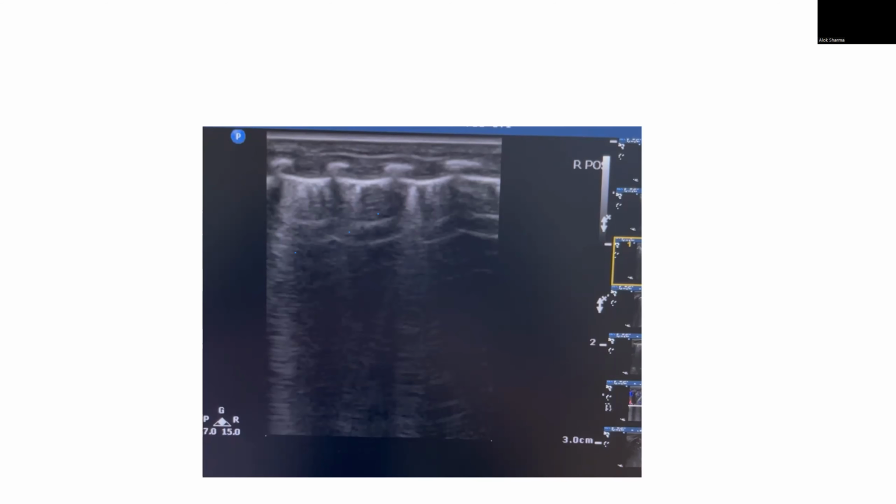So the pneumonia presentation here is a nice example of a focal presentation, but some babies can develop patchy consolidation with shred sign in both lungs. A good example in our part of the world is gram-negative pneumonias affecting both lungs, where you have a lot of shred sign with patchy consolidation as opposed to that focal region. So the presentation can be quite diverse. This is a really nice example of a focal pneumonic consolidation with atelectasis.